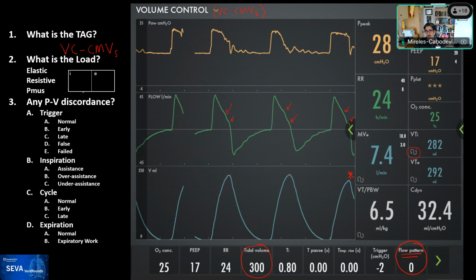So yeah, now you've heard the whole discussion, but it's PMUS, right? So during inspiration. Now I'm gonna flip it a little bit and ask you, besides the fact that Rob said that this was PMUS, what key features tell you that this is PMUS?